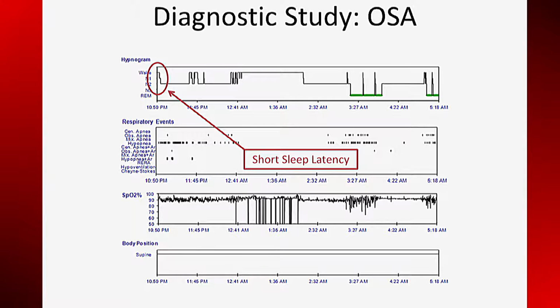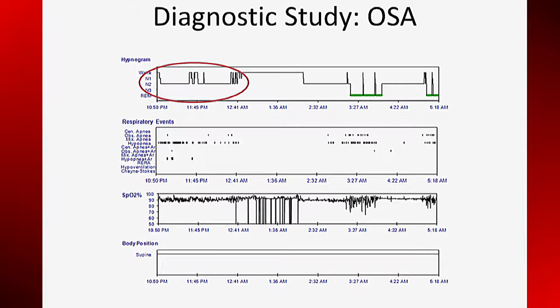We see a very short sleep onset. We expect the numerical data to show a short sleep latency consistent with sleep deprivation. I see three stages to this study. During this first stage, there is no REM sleep. Non-REM sleep is fragmented, particularly at the end of this stage.